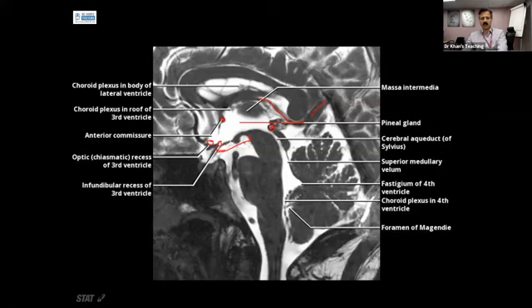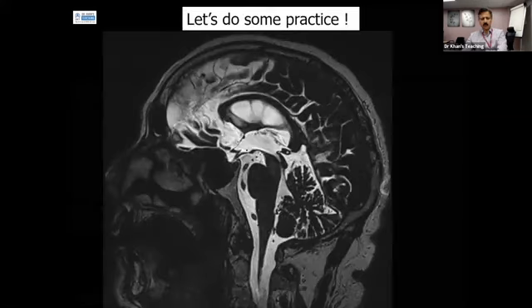And this is the anterior perforated substance, which is not radiologically seen, then the mammillary body, and then the cerebral peduncle. So a lot of action here, and we have built further on whatever we had learned previously. So this is a sagittal sequence, which we do.